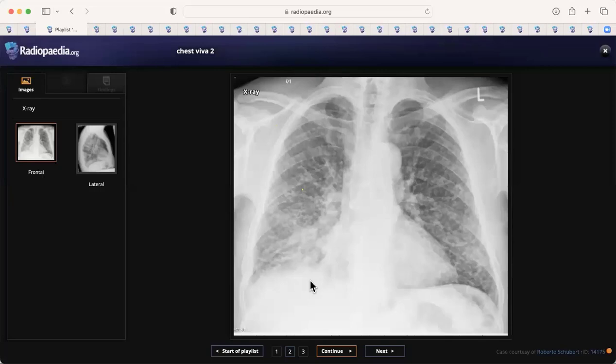If the patient is well and afebrile, that could be healed varicella. However, I can't see any calcification, and healed varicella would usually be calcified nodules. Other differentials would be metastatic miliary nodules from thyroid and renal primaries. There are other miscellaneous causes of miliary nodules, one of which you mentioned, which is sarcoid.